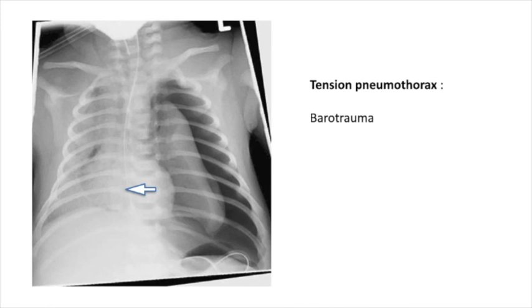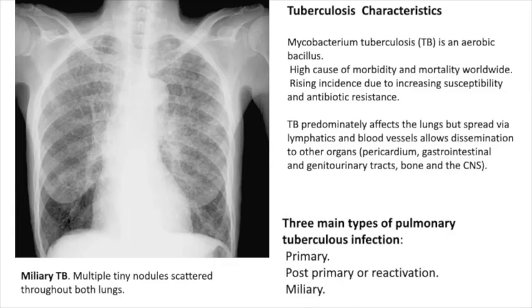We have diseases like atelectasis, pleural effusion, and pneumothorax, which you have to take into consideration when looking at the mediastinum, to which side the mediastinum is going, whether it is pulling or pushing or shifting to which side. That's very important to know. You have to put that inside your brain.